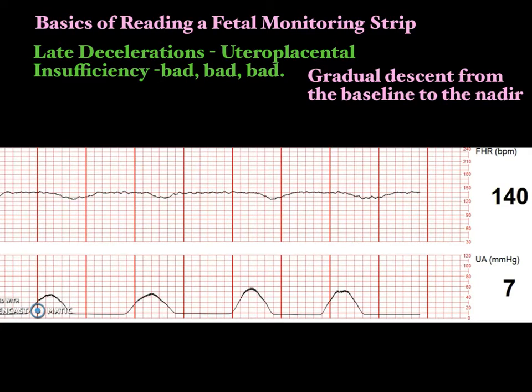And they might start running late. And then the cure for that, you'd bolus them with some fluid and maybe get some ephedrine on board, and then you fix them. But if this is happening and it's just in response to a normal labor, that can be pretty concerning because this is a baby that's not going to tolerate the normal stresses of labor. So that is a late deceleration.